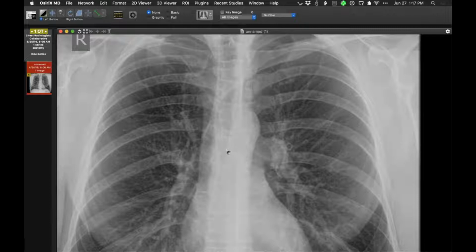So this isn't a common interface, but it's a situation where lung, in this case, the right upper lobe, abuts the lateral margin of the aorta. And of course, usually that doesn't happen because there's so many tissues and items that prevent the lung from touching the aorta here. Fat, SVC, right atrial appendage, and so on and so forth. But this I'm pretty confident, and I've seen this before.